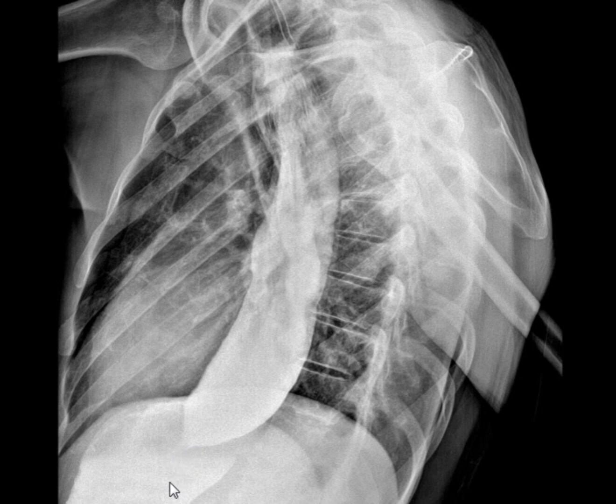Second, I told you he has a long history of dysphagia. Carcinoma will not have that. If it's esophageal carcinoma, what would be the appearance? It will be irregularity, shouldering. So this is a rat tail appearance of achalasia.